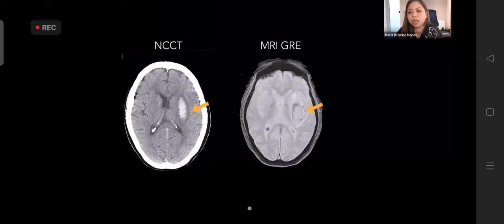So for acute intraparenchymal hemorrhage, it will not really appear blooming dark immediately. What you would see is actually an isointense collection in the brain with a rim of hypointensity or susceptibility signal. So you have to remember that for the hyperacute to acute hemorrhage, it will not present with that blooming dark signal on GRE and SWI.